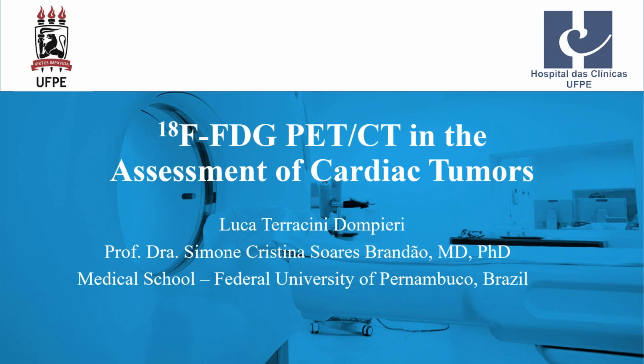It's very important because you have a high uptake in the normal myocardium and sometimes it's very difficult to differentiate where the tumor is, and you have to locate the tumor with the CT image and see if the uptake is inside the tumor, really the tumor, in the state of high level of glycemia.